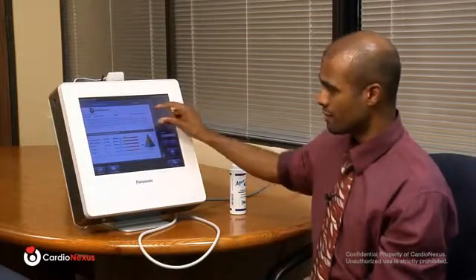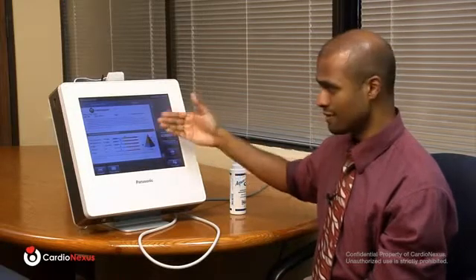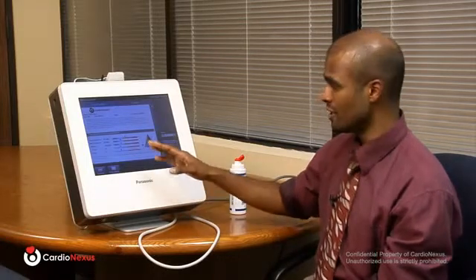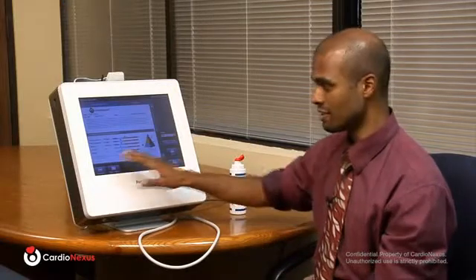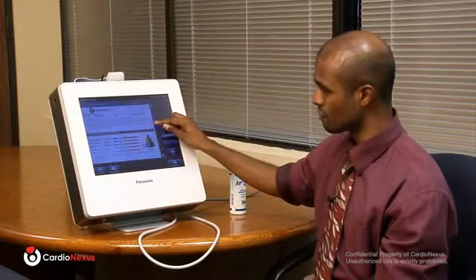So just below that introductory paragraph, you have the traditional risk score. In this case, Framingham was selected. And at the bottom, you'll see based on Framingham, based on traditional risk factors, your chance of having a heart attack in the next 10 years is 8%. And then you have a schematic here representing that overall risk.